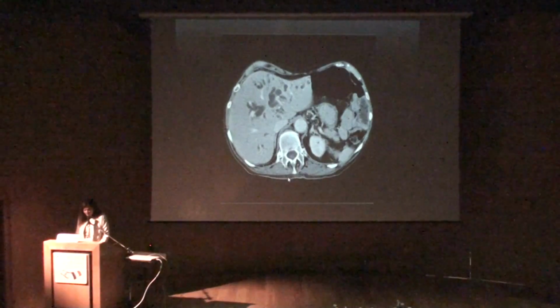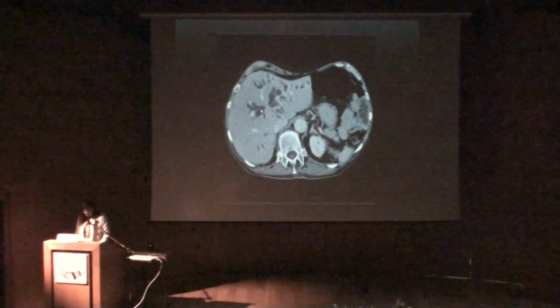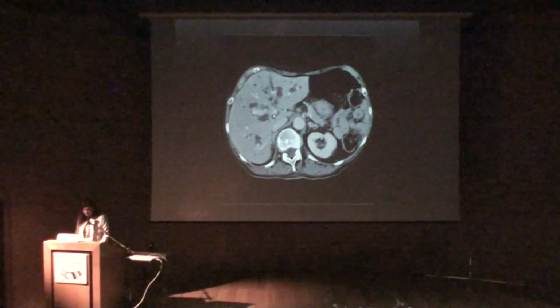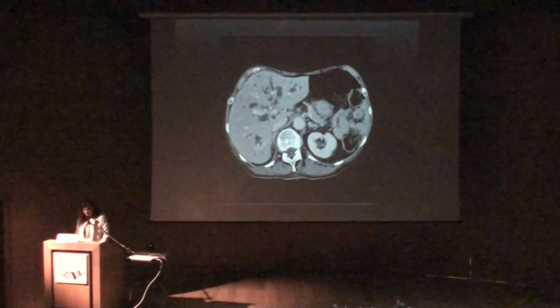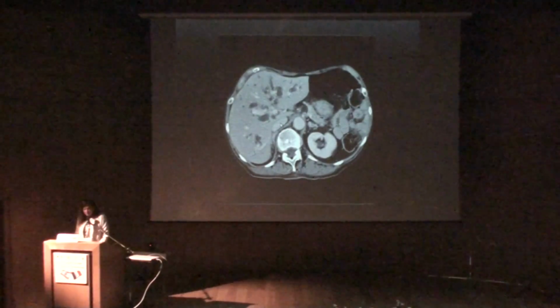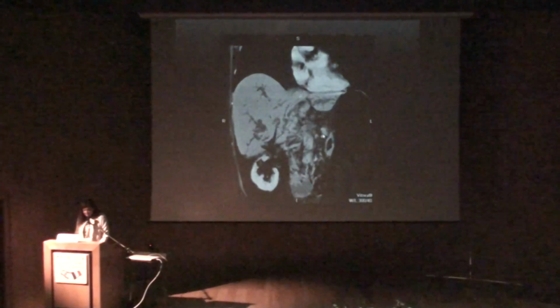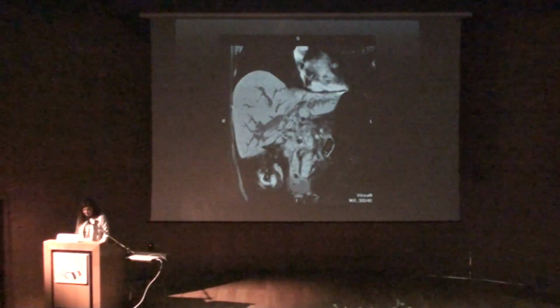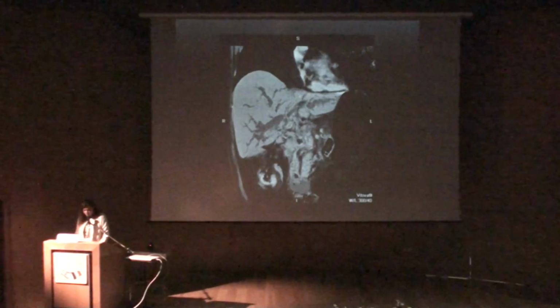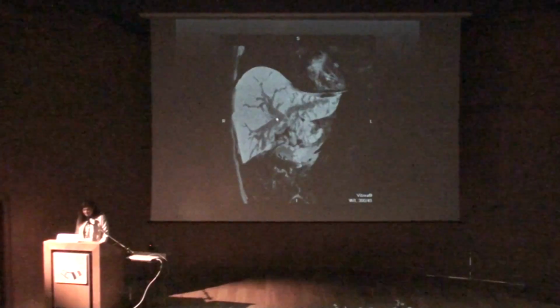I show you one example. So, look at this patient. There is bile duct dilatation. You very nicely see here this little tumor, cholangiocarcinoma. If you want to answer the question for the longitudinal extension of bile duct, you do MPR and you do minimum intensity projection, as you can see here. You see the bile duct dilatation.